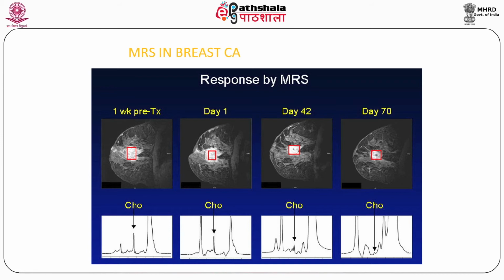Now, this suggests that this tumor is responsive to chemotherapy, and this is well predicted by our modality, which is the MR spectroscopy. This can help prognosticate such a case, and this is definitely a responding case of MRS, which information could not have been obtained by a conventional MRI, which could only let us know on the size criteria and reduction in size and necrosis, whereas MRS can let us know on the specific chemical changes that occur in responders when specifically charted over time.